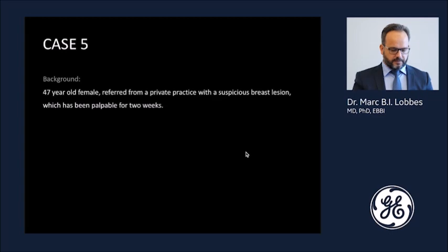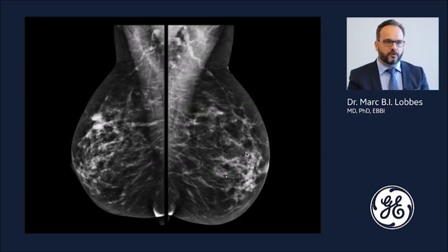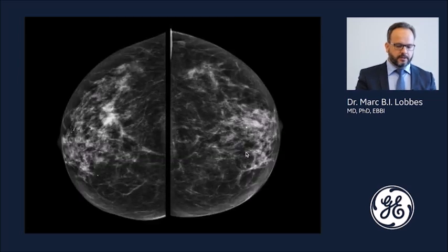Now, this is the mammogram, the low energy images of both breasts in mediolateral oblique view. And the accompanying images in the craniocaudal view.